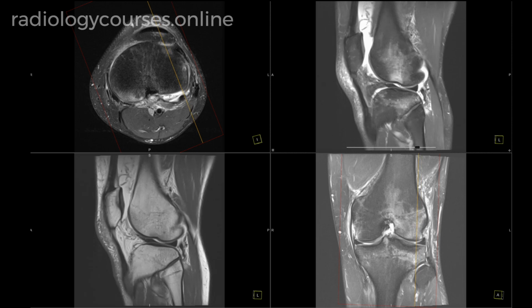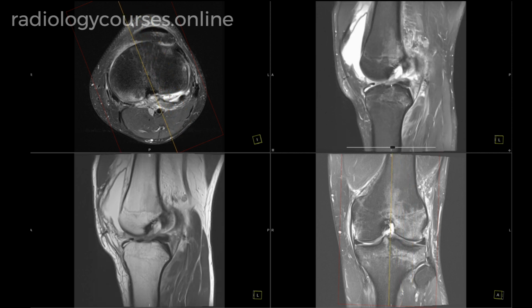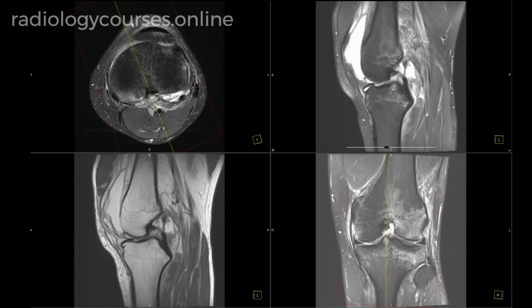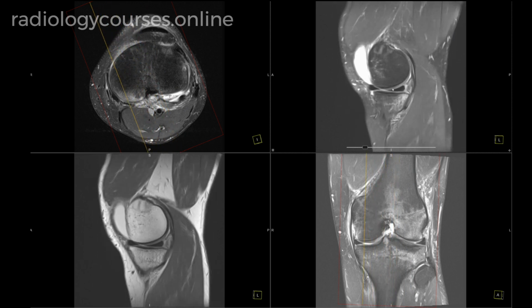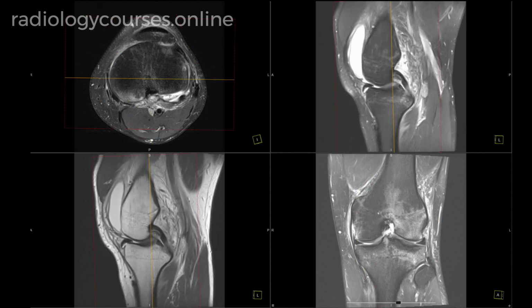In addition to that, we find a small smooth depression in the mid-lateral aspect of the lateral femoral condyle in pivot shift contusions. In pivot shift contusions, most of the time the ACL is completely torn, as we see here, and this is associated with medial or lateral or both meniscal tears. In this case, there is none. They are also associated with MCL injury.